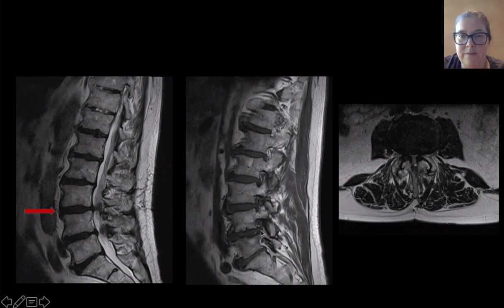If we look at the neural foramen, you do still have a little bit of fat surrounding the nerve root. This one, I would argue that the nerve root is actually deformed. It is compressed, and the fat, yes, there's a tiny bit, but it's essentially gone. I would call this severe. Similarly here, I think you really need to be able to scroll. It looks the same as the level above. The nerve root looks compressed, the fat's almost gone. I would call severe. Here you've got contact and effacement of fat, maybe just in one direction, mild. I can't really see the other ones well enough.